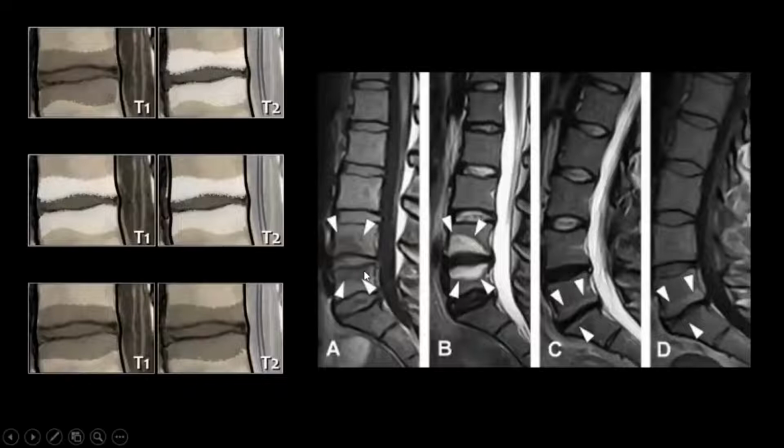So an acute Modic change is usually edema or fluid, so it is hypointense on T1 and hyperintense on T2. As it becomes more chronic, fatty changes happen. So these are hyperintense on T2 and hyperintense on T1. Interestingly, if you made note of the annulus fissure over here, when they become chronic, sclerosis happens. Sclerosis is calcium, and therefore it is hypointense on both T1 and T2.